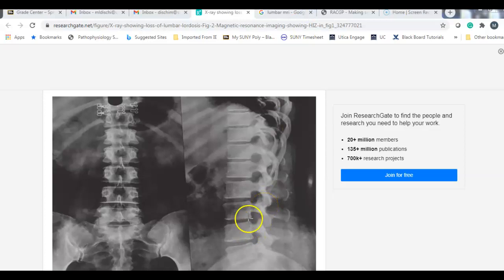And it's because this person doesn't have normal alignment of the lumbar spine. You know, the S shape in normal spines makes it almost like a spring. So it's a little more resilient, and there's some almost spring back of the spine. When it's in the normal curvature, creating that nice in curve on the low back and the nice out curve on the thoracic spine.